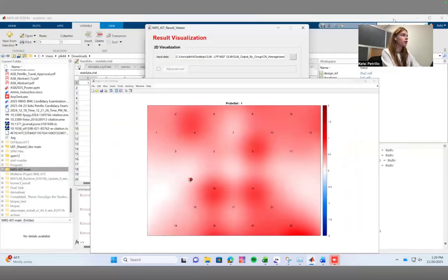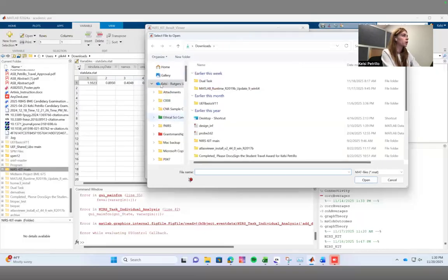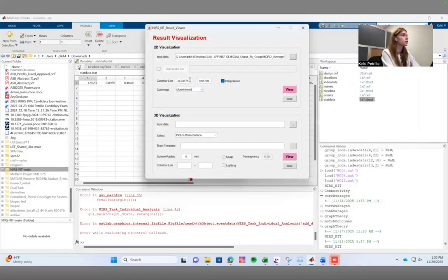Now, on the other hand, this data set that I'm working with, we also have a group of people who have some cognitive impairment. So just to give you a frame of reference, if we wanted to look at our other group, we'll set the same range, -2 to 2.